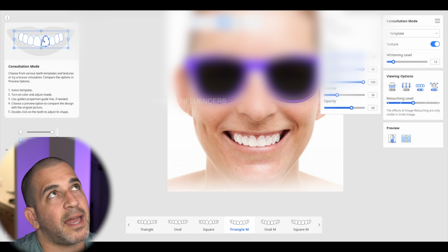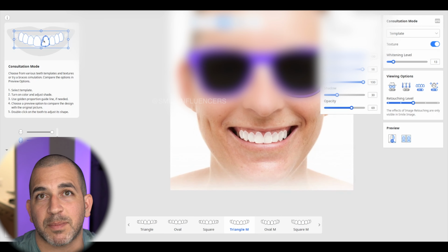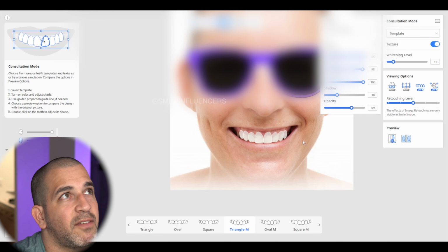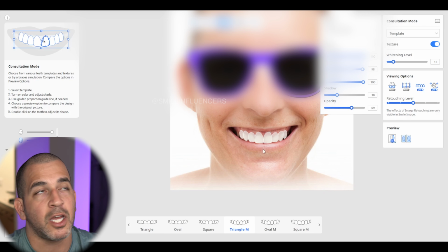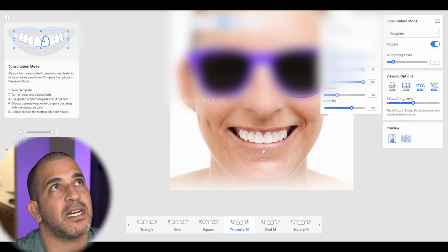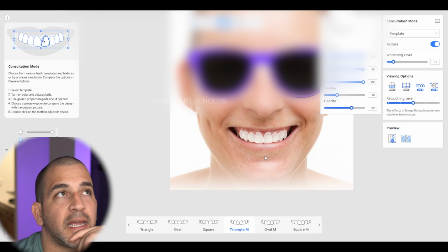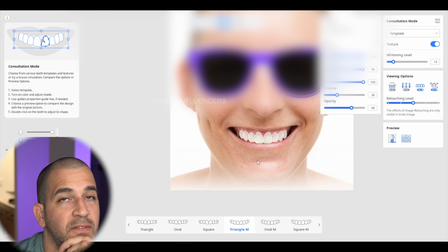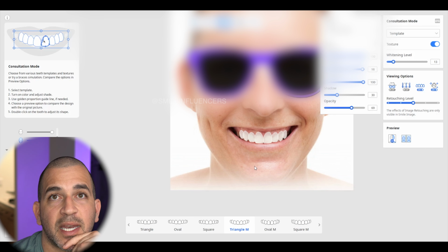And just like that, within a matter of, this says 12 minutes, but I'm also recording a video, so maybe 5 minutes chair time, just kind of messing around, giving you a brief, quick idea, you can give the patient an idea of how their teeth would look if they were to go through a major procedure like a crown lengthening procedure and veneers or any cosmetic dentistry.